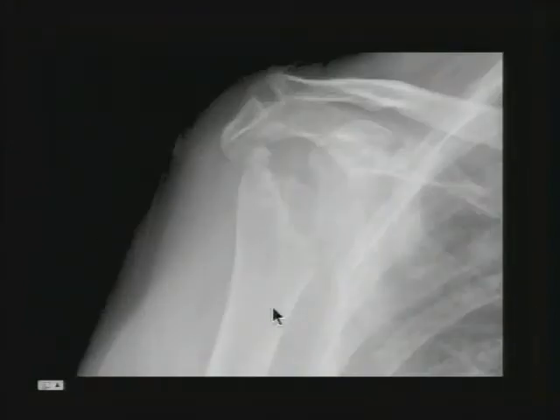Now, what about this patient? That looks really funny, and I have a differential for somebody who doesn't have a humeral head. And the first thing, of course, you would say is the syrinx, syringomyelia is the first thing. But there could be other things. It could be infection that got rid of that.